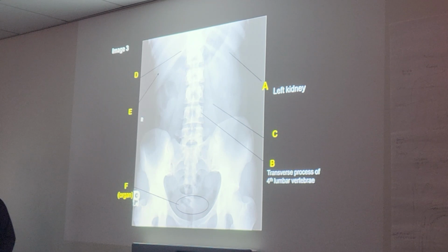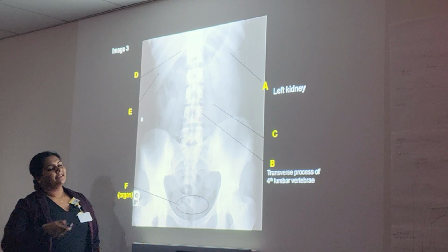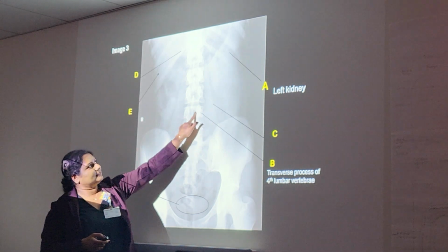Hold on, one second. No? Transverse process. Remind me. Yeah, it's the little wing. It's a little wing that they stick out. The circles are the pedicles, right here next to it, right? Yeah, so that is the transverse process. Okay, it looks like the pedicles. I thought you were pointing at the hole. I thought you pointed at the hole. This thing right here.